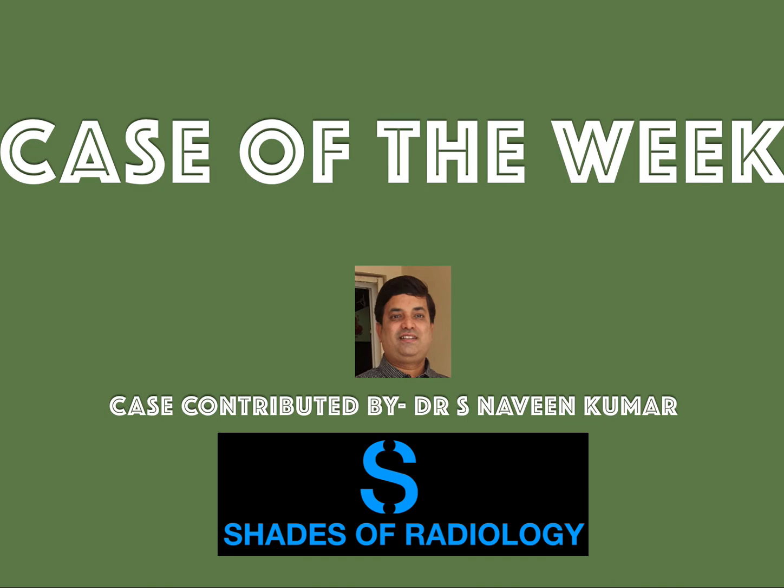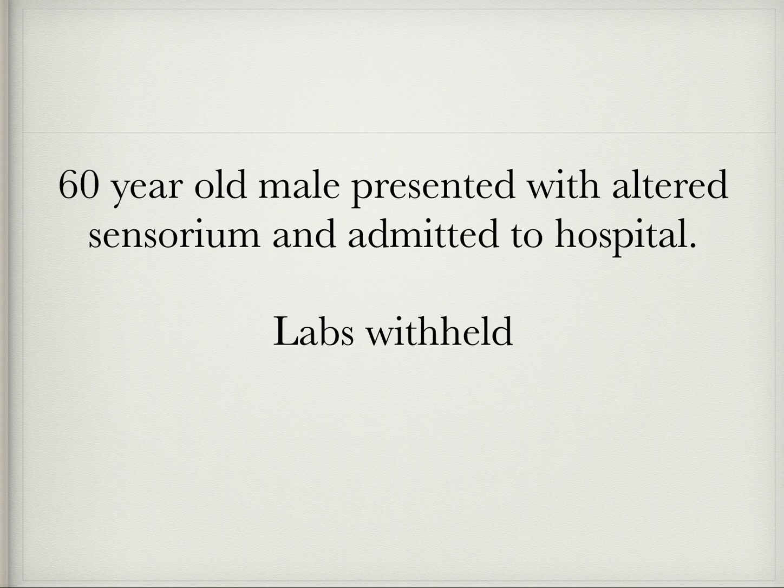I would like to thank Dr. S Naveen Kumar for providing this excellent case for the discussion. A 60-year-old male presented with altered sensorium and admitted to the hospital. Laboratory results are withheld. So let us see MRI was done. What could be the cause for his altered sensorium?